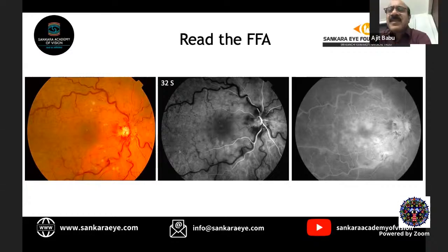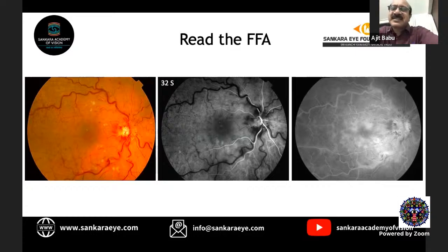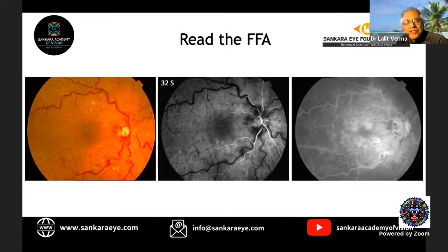How much would that delay be? It will be very small, about 2-3 seconds, not 10 seconds to 32 seconds. Yes, it would not be this much more, sir. That's a very subtle quiz question, but not for this angiogram.